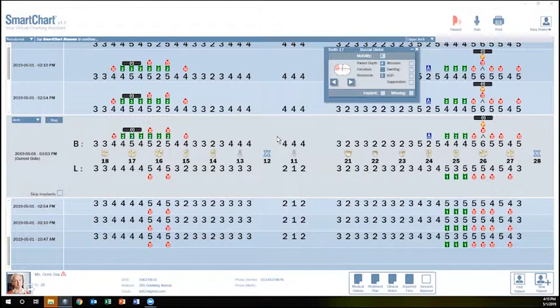So let's go through some of the highlights of SmartChart. We already discussed the pause button on the upper right. When I click on it, everything in the box to the left highlights in red, which means it's waiting for your voice command. So it's ready to start. When you say start, this highlights an input box. It notes all of the conditions that are available for entry, and also gives you your exact position on the tooth, whichever area you're on.